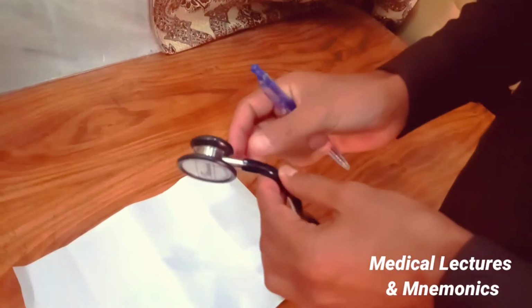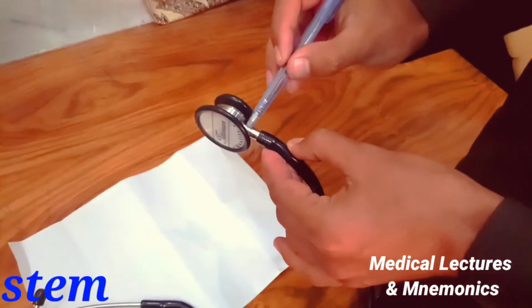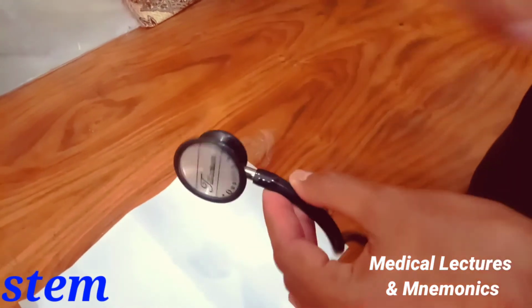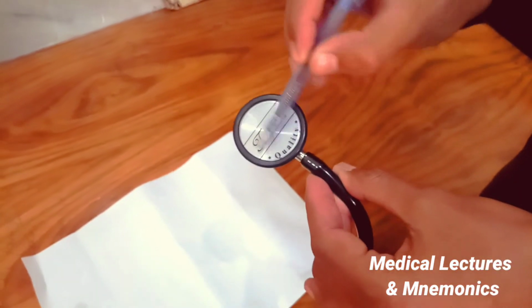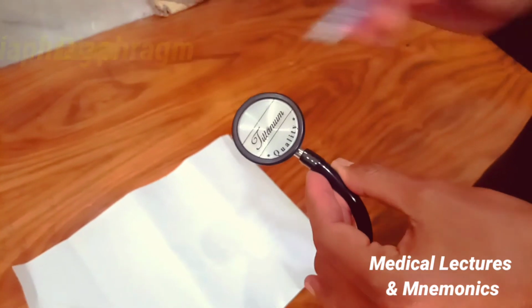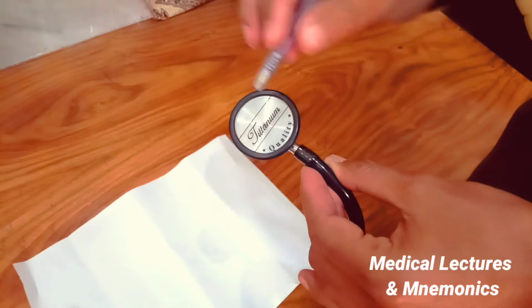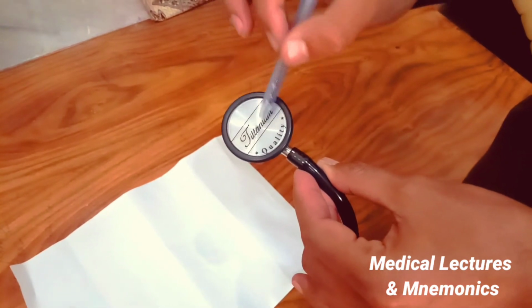And this is called a chest piece. This whole part is called a chest piece. This is the stem of the chest piece. And this is the diaphragm of the chest piece, which actually records the high pitch sound. And this rubber ring actually fixes the diaphragm in position.